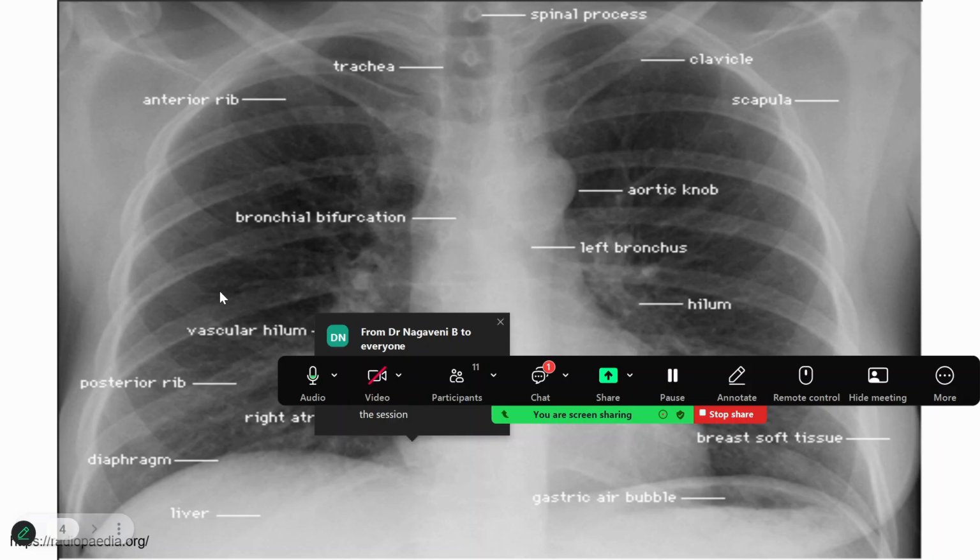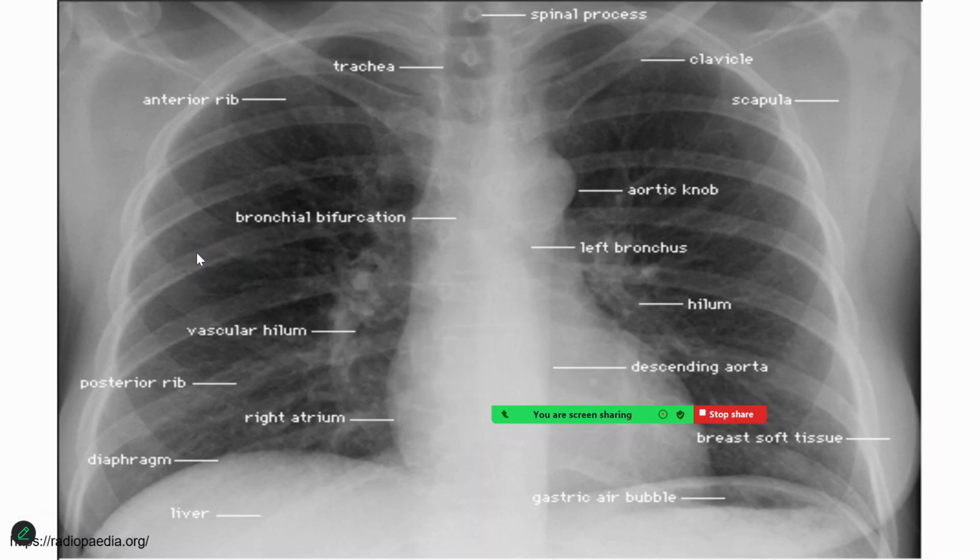So we will have to study these lung patterns, the vesicular pattern of the lung tissue, the alveoli. They are seen as a fine, small network, and they show you the normal pattern of the alveoli. And then, of course, as you come in, the bronchial divisions, the bronchial tree, the finer branches of the bronchioles and the bronchi are seen, and they gradually become wider towards the medial side from the periphery to the middle, or they taper from the midline to the periphery.